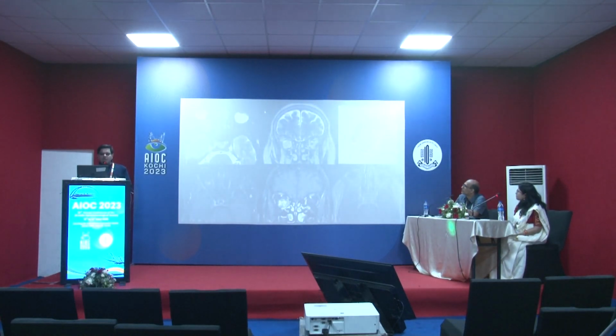This is a 38-year-old lady with an intraconal lesion. Again, a T2 bright lesion. I'm not sure if you can appreciate it, but there are fine septations inside it, which kind of resemble the pathology specimen. This lesion has good margins. Now, when we see a lesion like this, we do a dynamic contrast enhancement. Why do we do that?